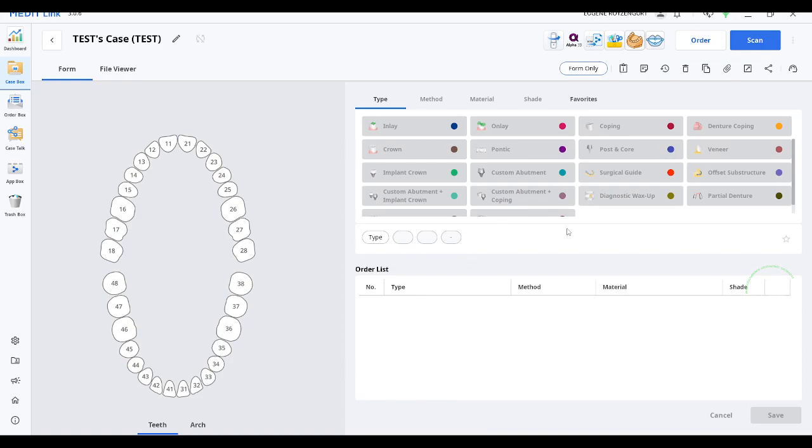And I did try to watch some videos, but I got a little bit confused, and I kind of gave up on it until lately. And I decided to follow my own steps. I did a little bit of digging through the program, and these are the steps that I came up with, and hopefully this will work again.